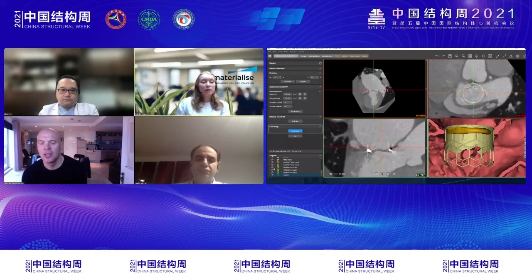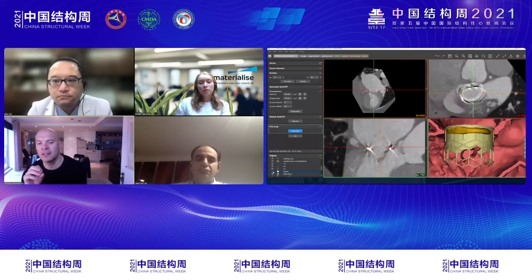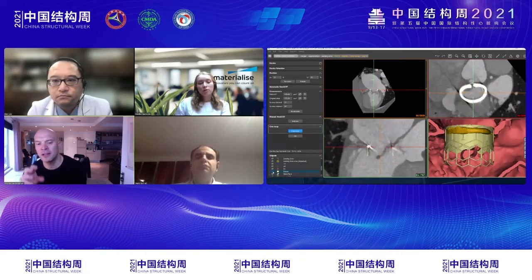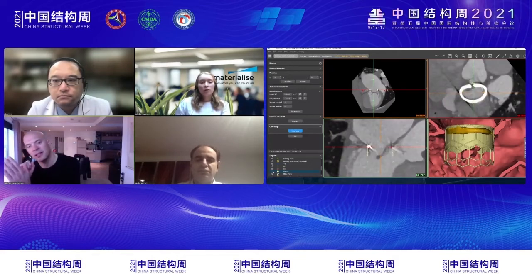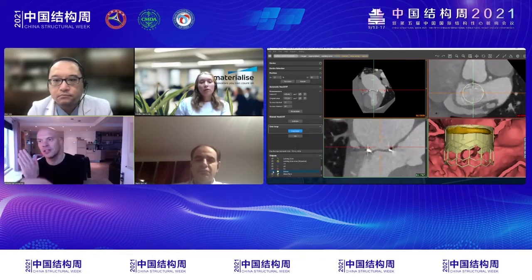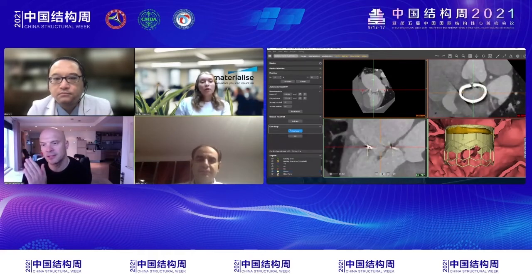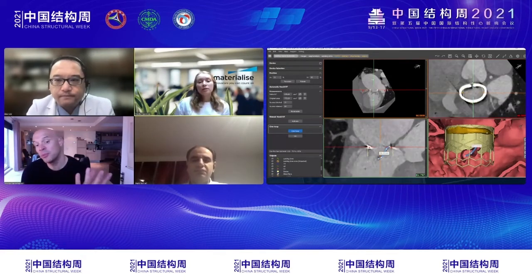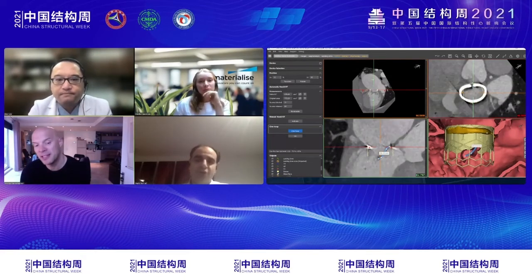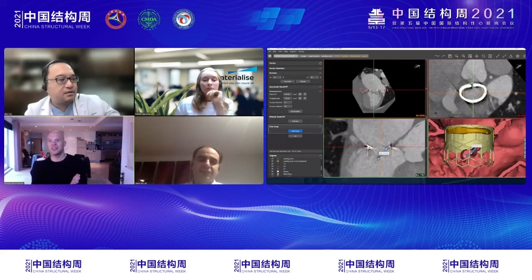So if I hide my device, you just have the... But basically what you don't have is what the result is after the device is implanted, because of course you push away that anterior leaflet and it can no longer have this systolic excursion. Yes. Yeah. No, of course. So that would be of interest, of course, if you could simulate. Sure. Right. In real life.